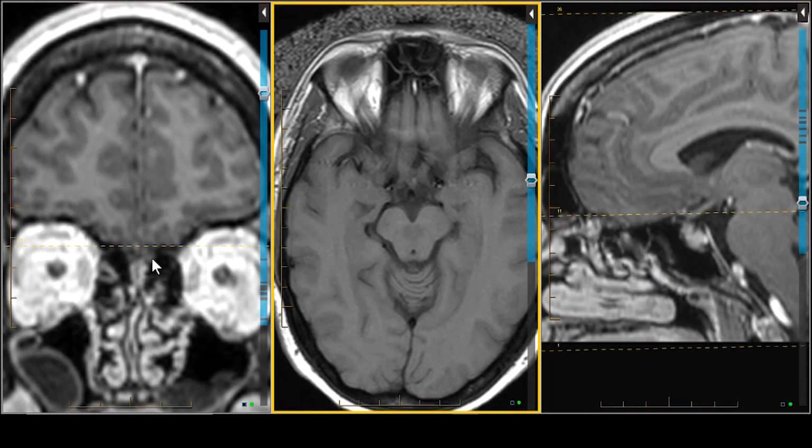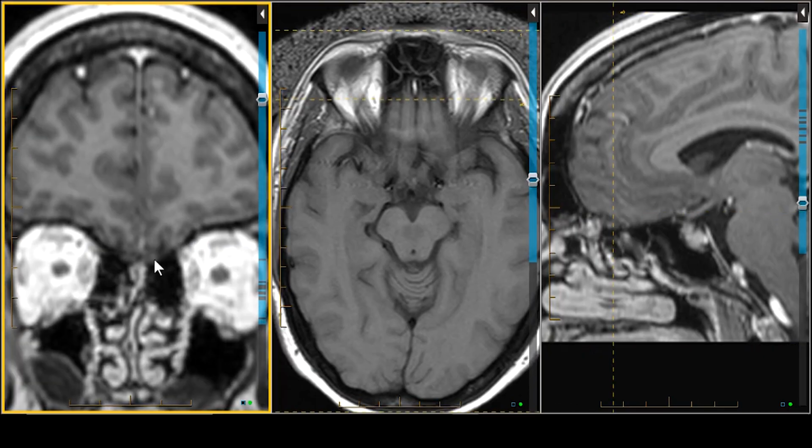Let's move on. Let's talk about the olfactory bulb. We can see it on a coronal thin section image. There it is right there. A bulbous group of paired gray structures lying just above the superior nasal concha and nasal cavity. Do a little scrolling here.